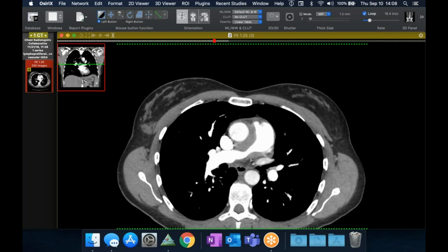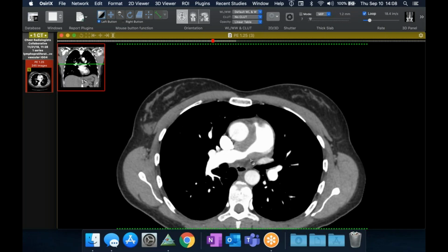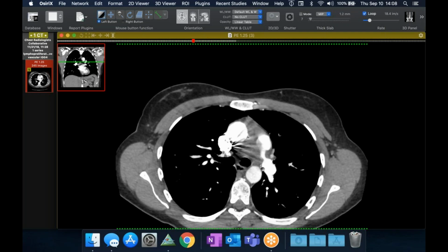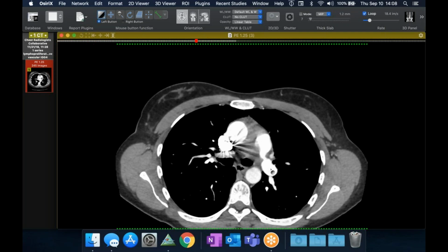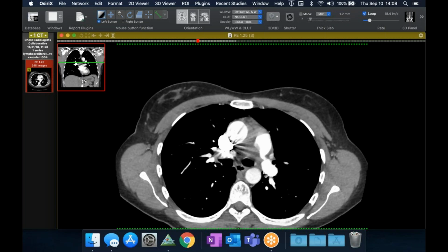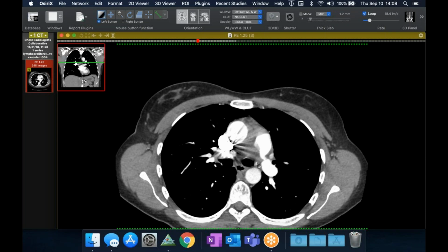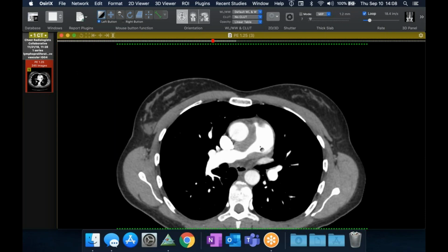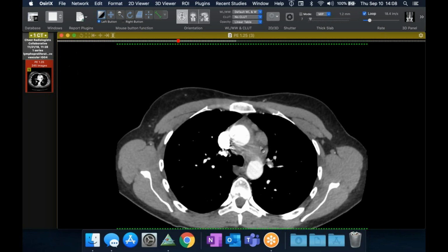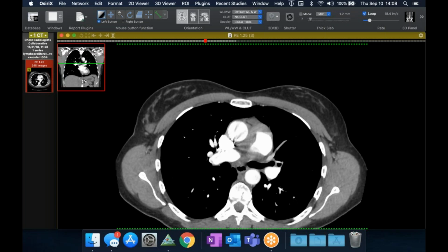This patient did have a biopsy, and this is IgG4-related sclerosing disease. It has been described in several case reports as causing perivascular involvement and vascular narrowing, as in this case. I guess the inflammatory cells invade the wall of the vessel, as well as form a mass around it like that. You can see this could mimic a large vessel vasculitis, but I think the extensive tissue outside of it should raise a question that there's something more than just intrinsic to the walls.